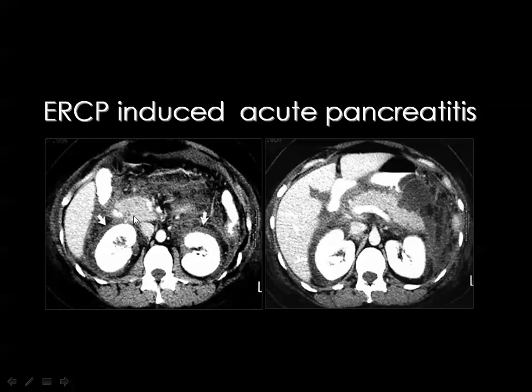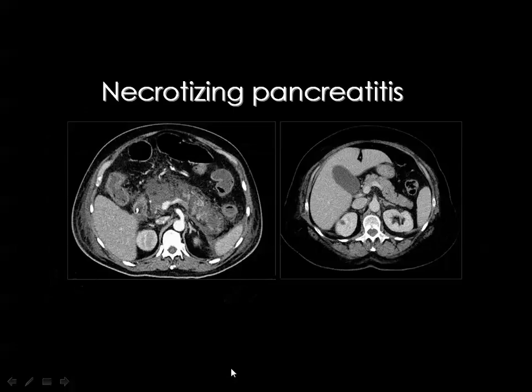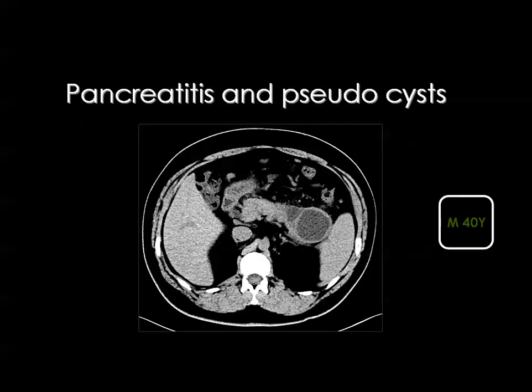all parts of the pancreas are homogeneously enhanced, and you see extensive fluid in the peripancreatic area as well as in the perirenal area on both sides. And this is the difference between the normal pancreas and the necrotizing pancreatitis, where you can see a heterogeneously enhanced, diffusely swollen pancreas with multiple areas of no enhancement, representing the necrotic pancreatic tissue. And also you can see the heterogeneous or strandy appearance of the peripancreatic fat planes.